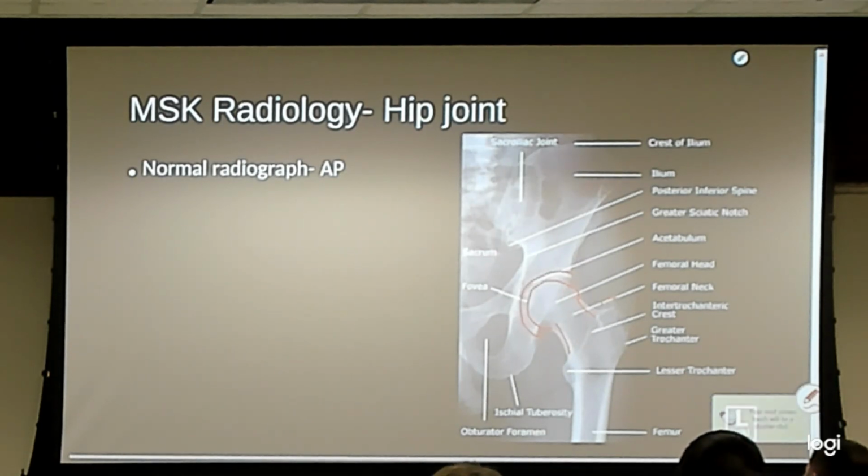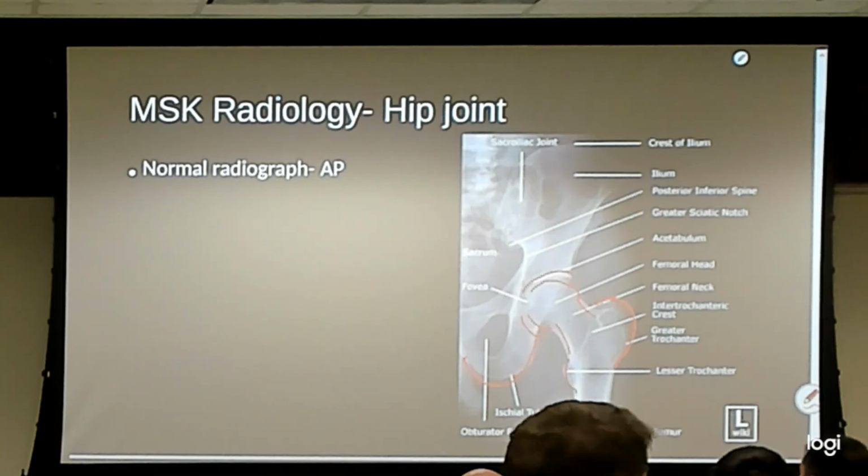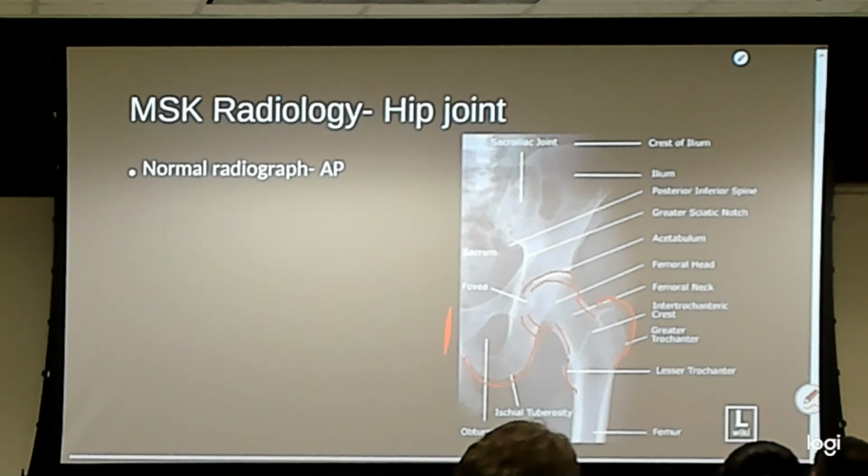Touch that button. Okay. Greater trochanter there, out laterally, like we talked about yesterday. It's the farthest part out on our hip. The lesser trochanter is this goober down here. Ischial tuberosity, that's what we sit on all day long. Talked about the fovea, which is where that ligament attaches. I take this off right there. It's a little easier to see that fovea, the notch. And then my image doesn't have it, but somewhere in here is going to be that pubic symphysis.